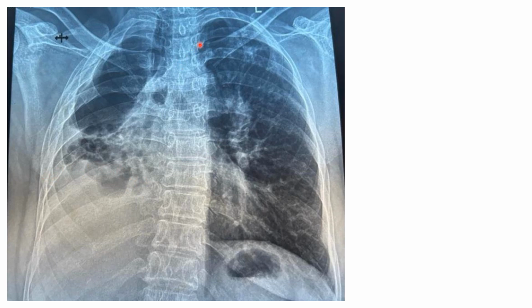And you see the left lung, so it's kind of larger. This cardiac shadow is shifted to this side, because normally cardiac shadow is up here, but it's not very visible. So it's shifted to the same side. This is the area where there is a volume loss, shifted to the same side.